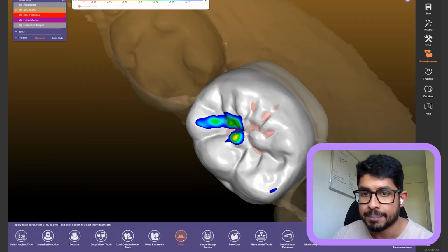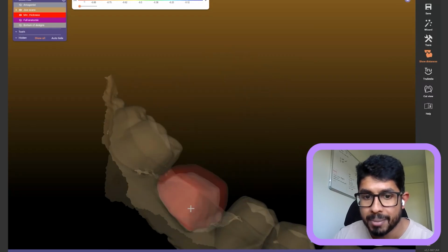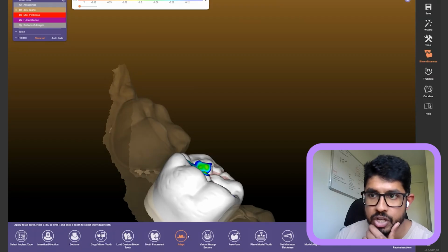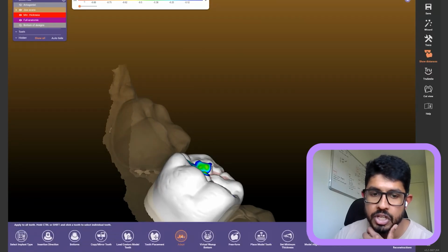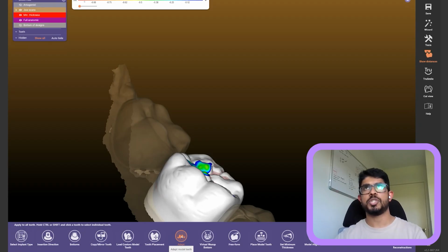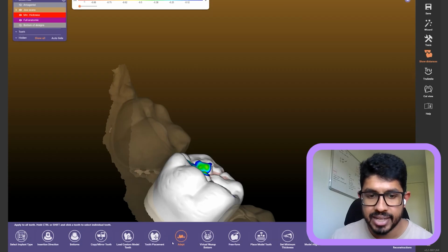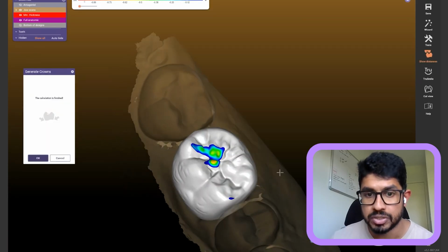But freeform is our next tool. Oh, sorry, we've got adapt. So this is just the tooth placed in there, but we needed this to adapt into our margins right now. So the next step is going to be adapt. You can actually see that when you're working in expert mode and you go down, everything gets highlighted to the next step. So you may not have the wizard mode that switches between each step, but you have the expert mode that actually highlights the next step for you, and you simply click that, and it simply pulls everything towards the margin there for you.